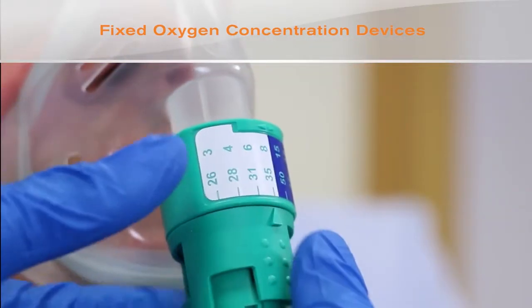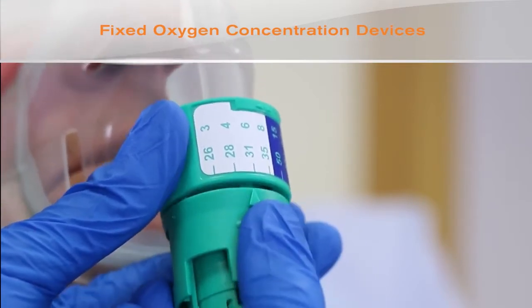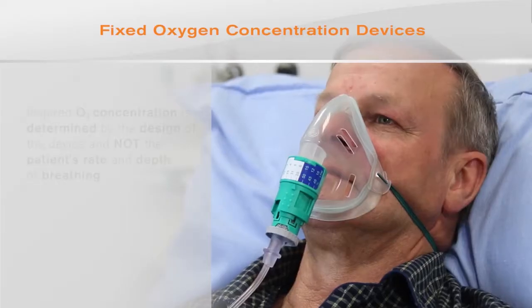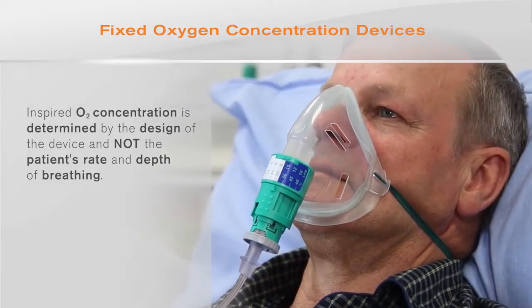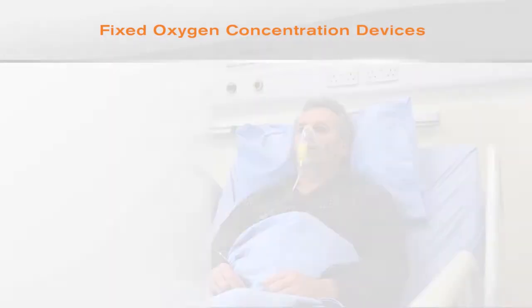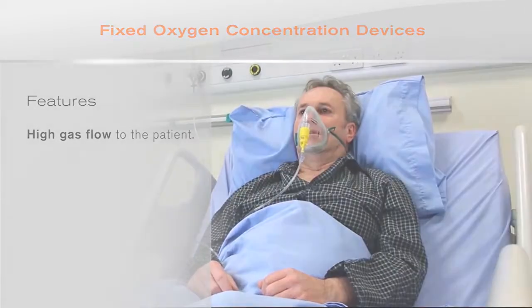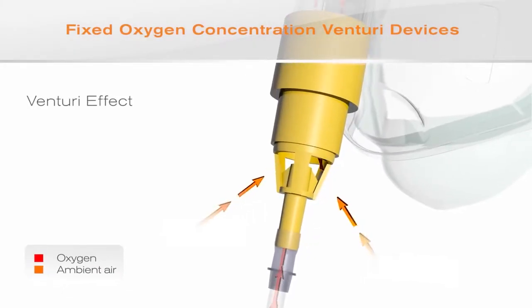A high-flow device in which the oxygen concentration can be carefully controlled and guided by blood gas measurements is more appropriate for these patients. The inspired oxygen concentration is determined by the design of the device and not by the patient's rate and depth of breathing. This is because Venturi devices accurately deliver predetermined oxygen concentrations at flows that are high enough to meet the inspiratory flow rates of most adult patients.